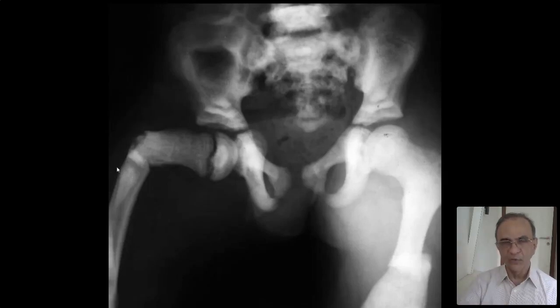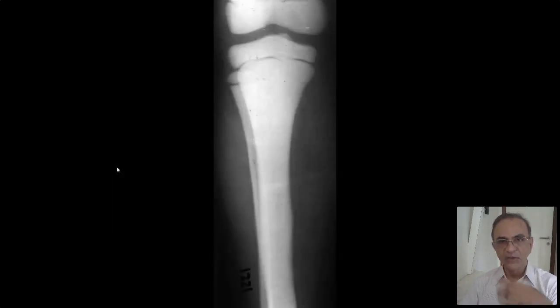So if you're looking at skeletal dysplasias in a country, and if you see sclerotic bone dysplasia, I repeat quickly what you should do. Increased bone density, look at the skull. Wide open fontanelle is not osteopetrosis. If the fontanelles are normal, it's osteopetrosis. Wide open fontanelles are pycnodysostosis and cleidocranial dysostosis. Look at the clavicles. If clavicles are normal, then it is pycnodysostosis. If the clavicles are abnormal, it is the other one. So let's move on. So this is sclerotic bone where you see no medulla, and this is classical of osteopetrosis.